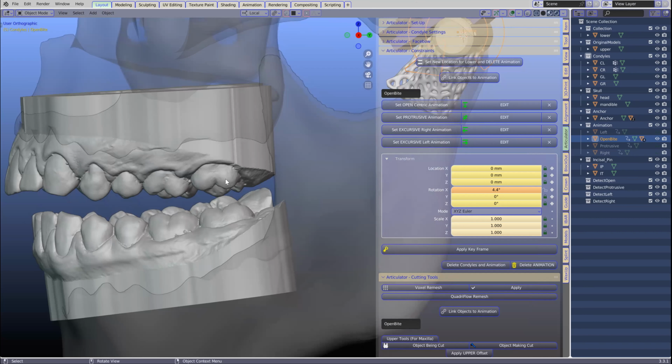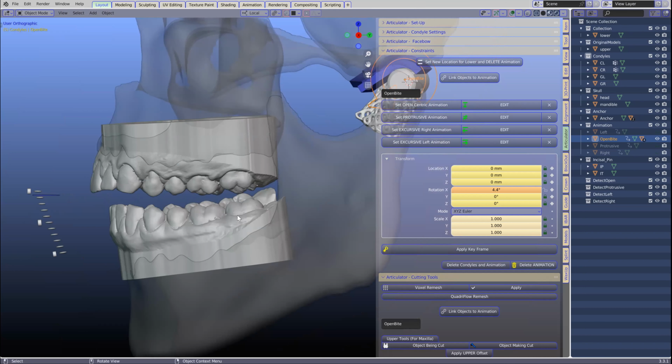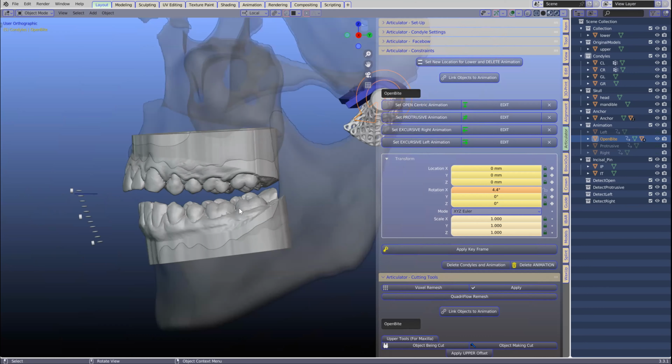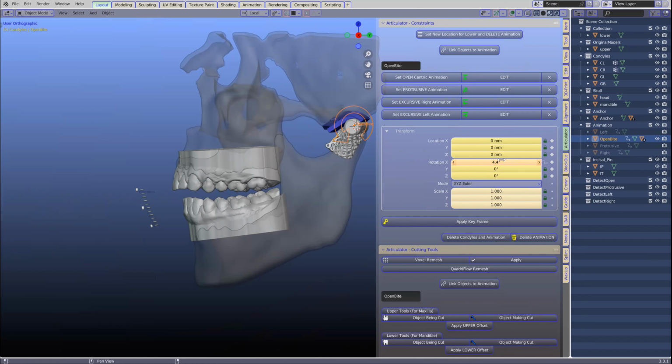I just need the mandible to literally move down a certain amount and forward a certain amount, the entire thing just go like boop, kind of like a right triangle. Okay, I sort of understand. So you have to move it forward and down at the same time. Yep, exactly like a right triangle.